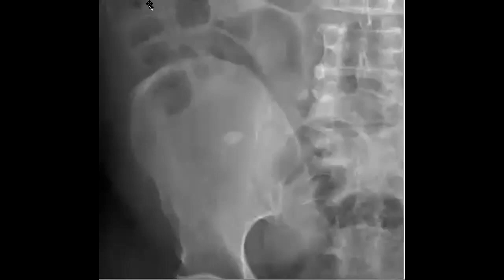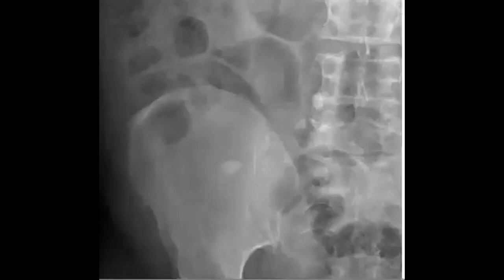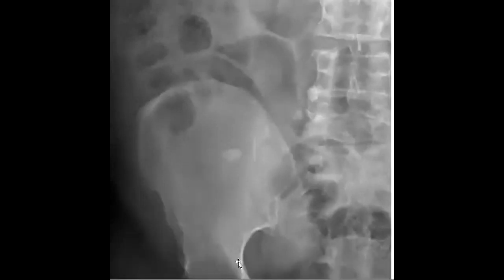Yes, it could be, one of the differentials is the urinary bladder. I will show you even what you want to. It will come. So what do you think about here? This one, right iliac fossa calcification. The first possibility is it could be appendicolith. And what about this?